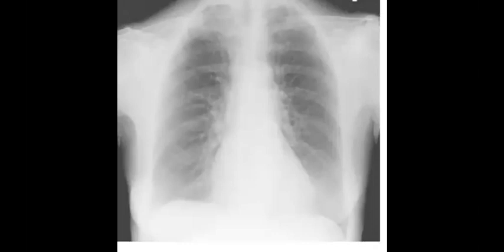Frontal radiograph, adult, maybe you can mention that it is female because you have breast here. And search your checklist until you find any positive. Maybe the lungs, I will try to help you, the lungs are clear. Cardiac and mediastinal contour is okay. The esophagus, if you check it, is not dilated.